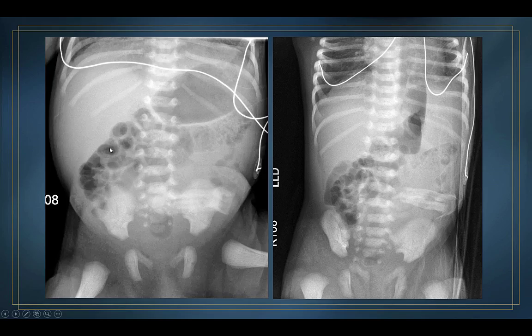Another example is the same thing. Here the baby's supine, and this is the properitoneal fat. And you don't have to see it all the way down. You may not, as in the last case, see it at all. But then on the decubitus film, which isn't very rotated, it's just more dramatic because the liver has now fallen away from the abdominal wall and it's not as compressed. He's turned a little bit to the left, but not much.